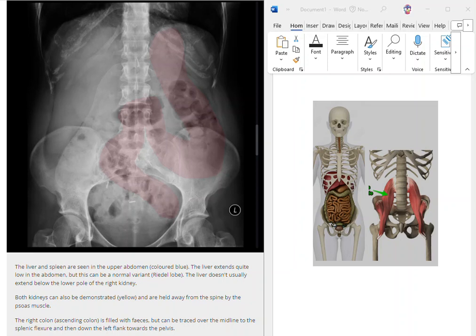That's why we have to go in and do oblique x-rays to show you those flexures in barium enema x-rays, right? Because they're overlapped and superimposed on our plain abdomen x-rays. All right, then we follow that loop-de-loo down the descending colon. The descending colon has some air in it, right? So they've highlighted the area of the descending colon, and then coming back over to sigmoid colon.